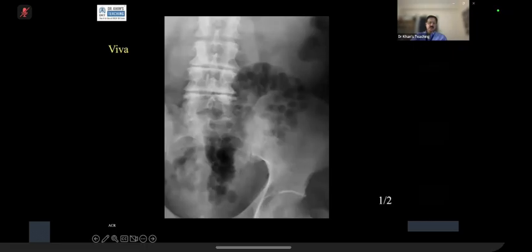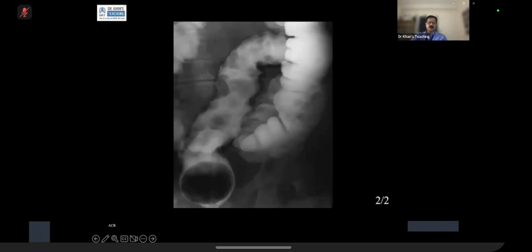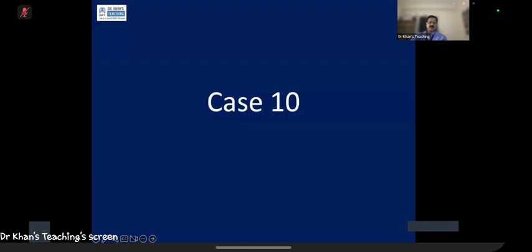And interestingly, this is from the American College of Radiology. And there is a barium enema, which tells you everything. Why? On the barium enema, look at these cysts and look how, in profile, some of them are bulging outwards. Look at this. So this is pneumatosis intestinalis. Now this case, and interestingly, in our hospital, we have one patient.